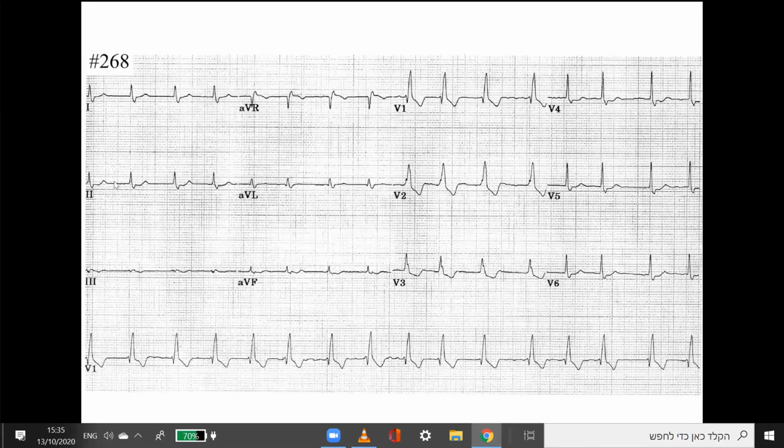Okay, so first of all, I think it's arrhythmic. This is arrhythmic, you said? Yes. So it's not rhythmic. Okay, good. So far, so good. I think it's about 100 beats per minute. That's fine. I think the axis is normal. And I don't really see P waves. Me either. So I would say it's atrial fibrillation, maybe? Not maybe. That's an atrial fibrillation.